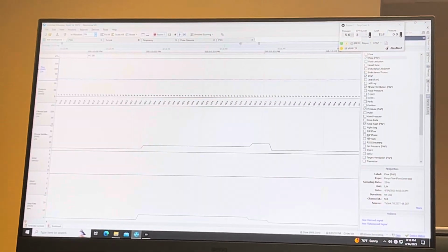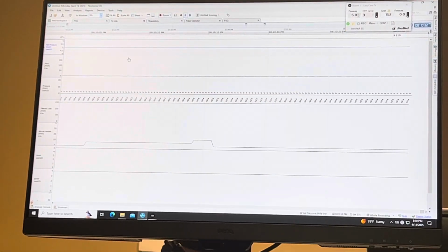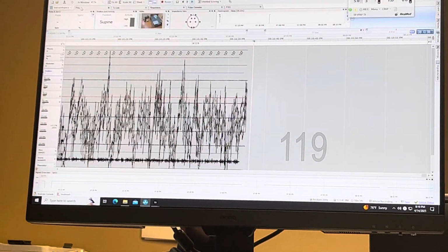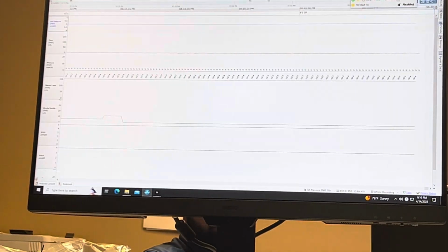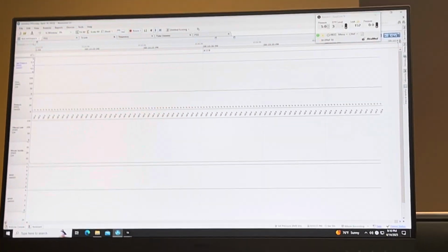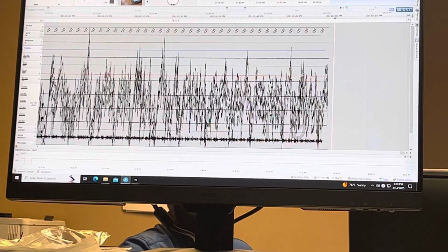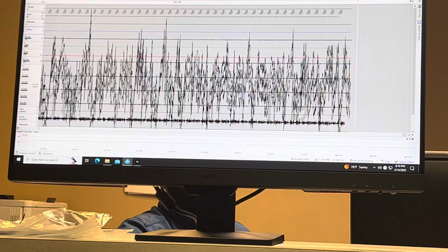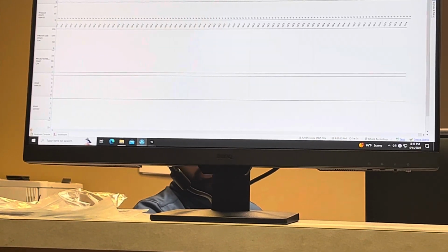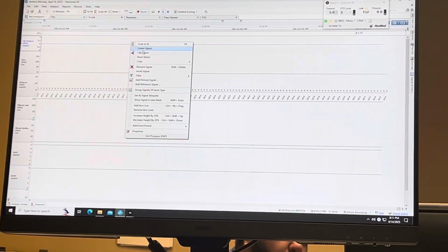So wouldn't we be able to just change it to a CPAP montage at that point, or no? What I would suggest is that your montage should have a PSG and a PAP sheet as part of it. That way you don't have to change your workspace, you can just click from the PSG that has your flow, your thermistor, all that stuff, over into your PAP sheet. That'll have your pressure, it'll have your thermistor removed, and whatever else you want to add to it.